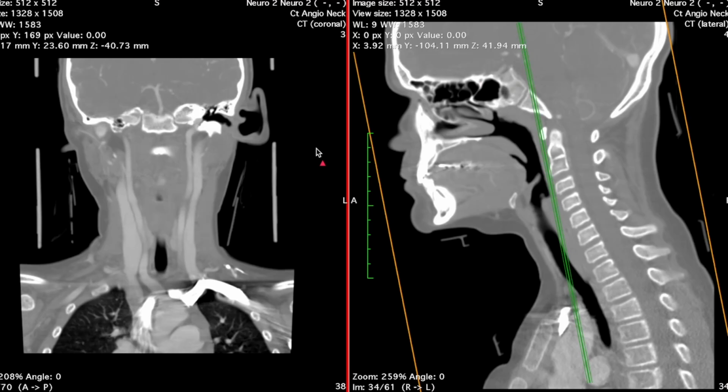To show you the vasculature on imaging, I'm going to be utilizing a CT scan with IV contrast, which is really going to make our vessels pop out on the screen. And to correspond with the image that I drew earlier, we're going to be looking at a CT in coronal view. The only issue with the CT that I'll say before we get into this is that it's a little bit higher than the heart. The heart would be somewhere around here.